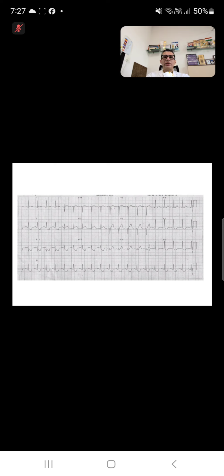So this is an acute thing. You can't wait for troponin either. Your troponin will take about 2-3 hours to come. But here you want to achieve revascularization in less than 90 minutes. So for that, the moment you see the ECG, you divide it into STEMI or NSTEMI. So this ECG is suggestive of a ST elevation MI, and this patient needs to be taken up for primary angioplasty or given thrombolysis if the patient is within the window period.